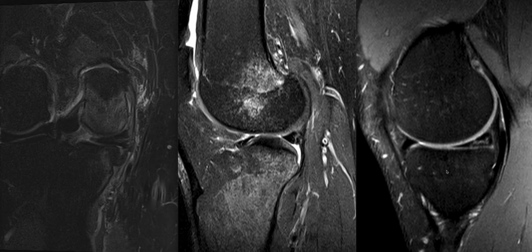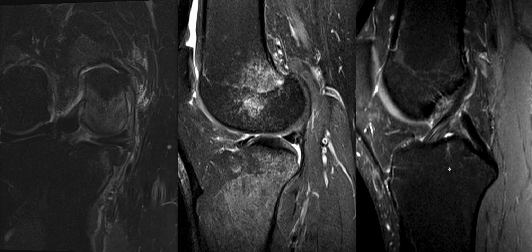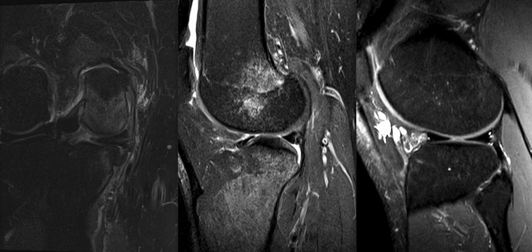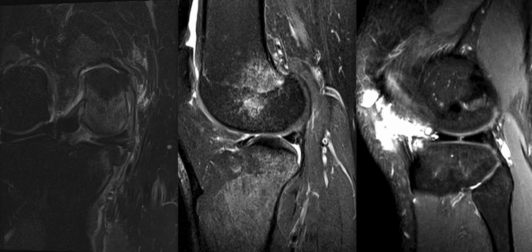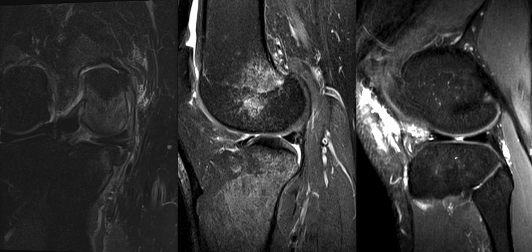The third tear type runs in and out of the plane of your screen, and this is the radial tear. And this patient has a radial tear in the lateral meniscus. Radial tears occur in two main locations. The first is this location, usually in the center or close to the center of the meniscal body. In the sagittal image, we see a small, well-defined defect in the meniscus. This is sometimes referred to as a cleft.